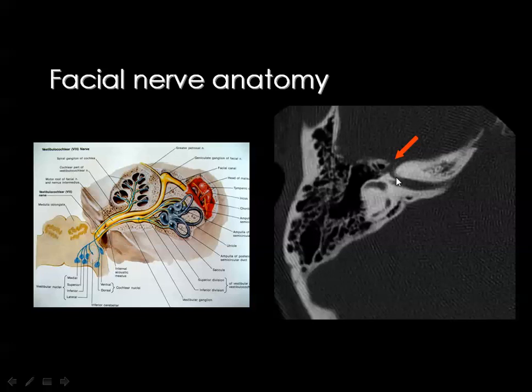And it is discriminated, of course, from the exit of the cochlear nerve by the presence of the cochlea opposite the cochlear nerve. But here you don't see the cochlea, and this is the nerve which will form this very famous configuration, let's say an inverted V. There is an ascending limb, a descending limb, and a dome. This dome represents the site of the ganglion of this nerve, which is known as the geniculate ganglion. This arrow points to the site of the geniculate ganglion, and this is the ascending limb, and this is the descending limb.